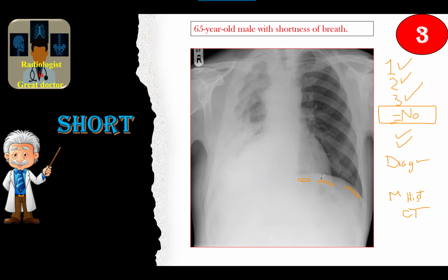This is an important point, a point of knowledge. You will take marks for this. Normal left lung field with no calcified pleural plaques, unremarkable bony cage.